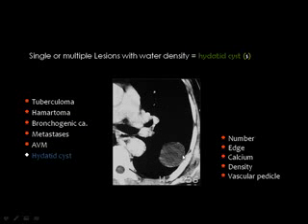Then if you see a nodule in the chest containing water, and you cannot know the content of the nodule unless you have a CT scan or ultrasound. If you see the nodule containing water, then the diagnosis is hydatid cyst. And I can safely say that the only nodule in the lung filled with water is hydatid cyst.